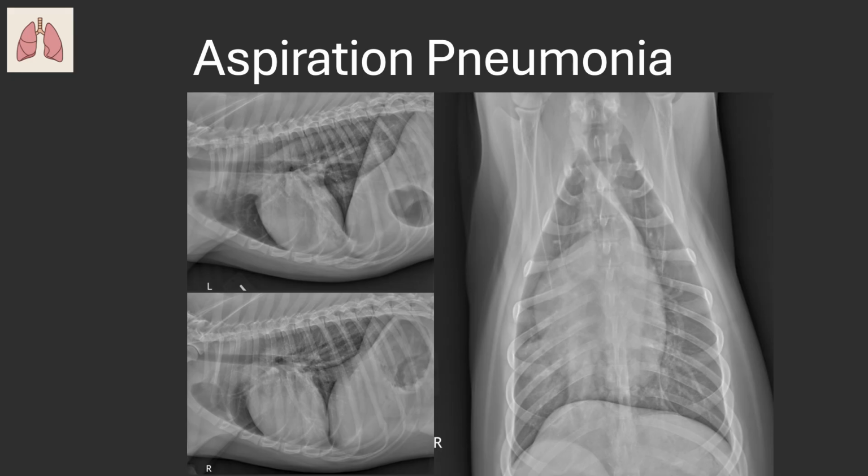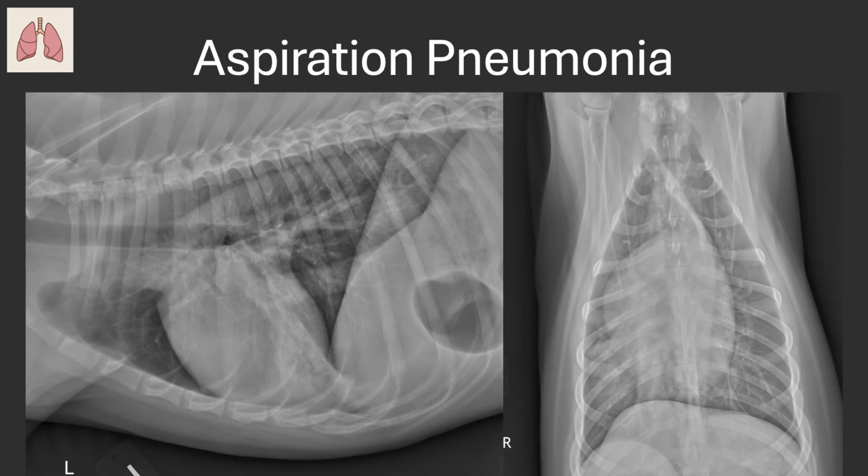Contrast this with these radiographs in a 2-year-old male neutered Mexican hairless dog. These 3-view thoracic radiographs were performed when the patient presented with increased respiratory effort, pyrexia, and increased lung sounds on auscultation. Take a careful look at the region of the right middle lung lobe, best identified on both the left lateral and ventrodorsal views.